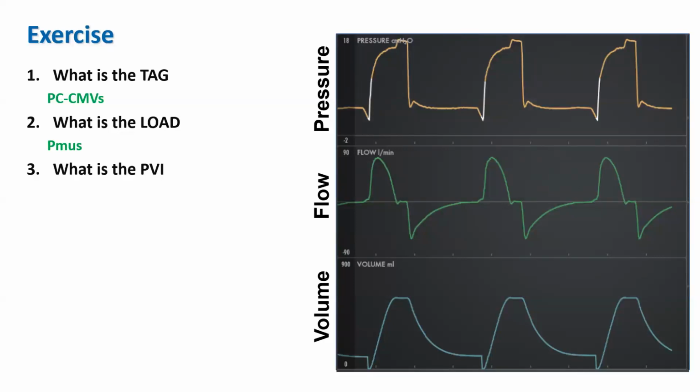What's the patient-ventilator interaction? Well, the trigger is normal. Not too much of a delay there. It's a pressure trigger. Inspiration. We have a little bit of work shifting because, again, this is bowed out. It's not a nice concave expiratory curve here, or exponential curve. Cycling is late. How do you know the cycling is late? Well, the patient is making an effort here. They stop making an effort here. When they relax, the pressure rises a little bit on the airway pressure because the ventilator can't catch up in time. It just rises to the preset pressure target.